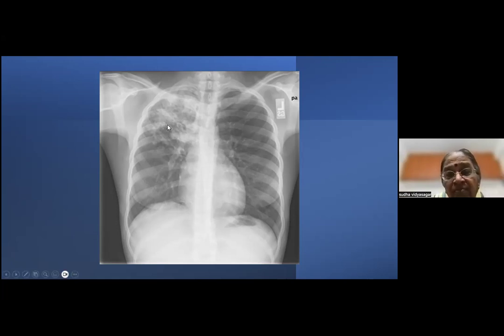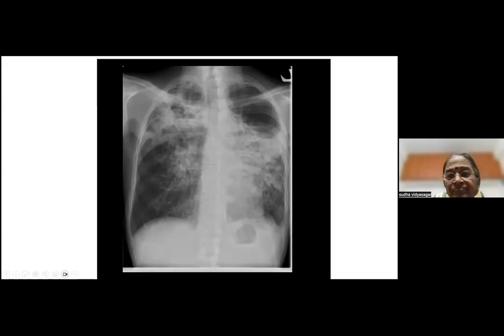But fibrosis and cavitation, if the patient doesn't have any symptoms, could be old tuberculosis. So go clinical. Go with fever, weight loss, loss of appetite, hemoptysis, pleural pain. The usual symptoms of active tuberculosis must be there for you to think of tuberculosis. Just don't go with the X-ray. But if somebody asks you to pin it down on an X-ray, then you say infiltrative tuberculosis, soft shadows are likely to be active, and a cavity in an untreated patient is a sign of activity.